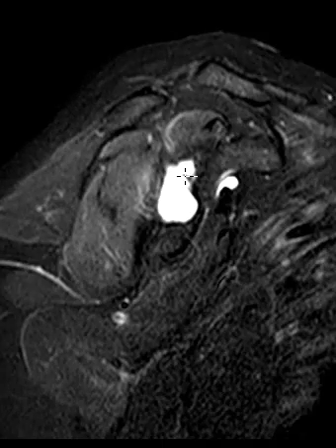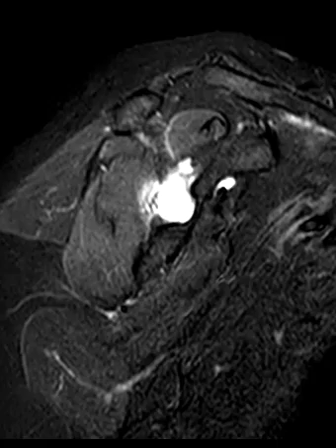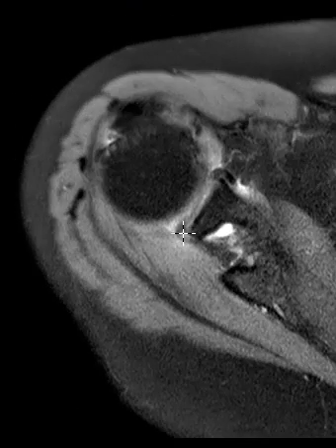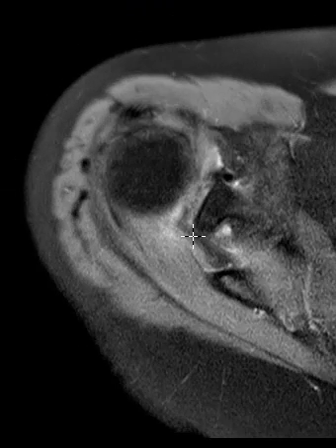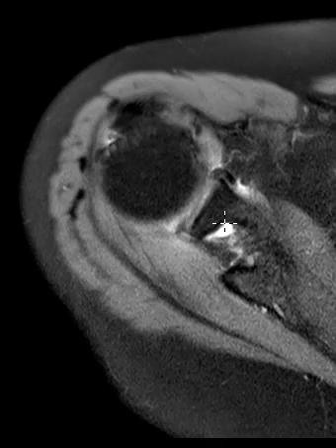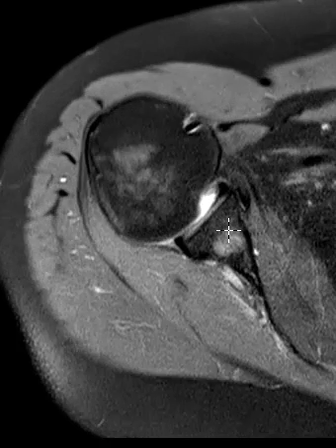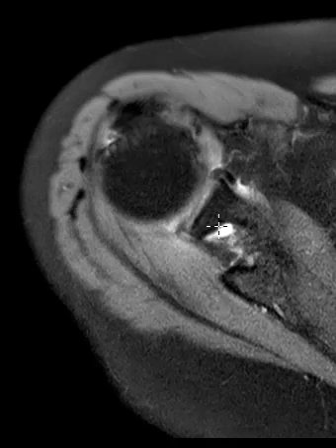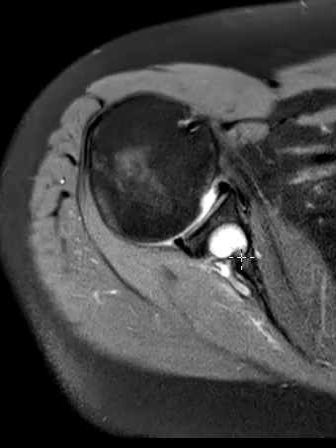So the first things to think about are, number one, a ganglion cyst in the spinoglenoid notch, and number two, a paralabral cyst that's coming off the back of the posterior superior labrum, and they go into there. Sometimes you can have a labral tear that's just scarred down and it's not even visible, and you can still have this communication. So this could be a big spinoglenoid notch ganglion cyst, or a paralabral cyst that's going back into here.